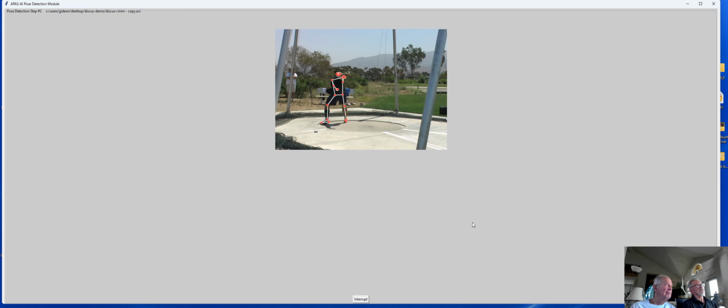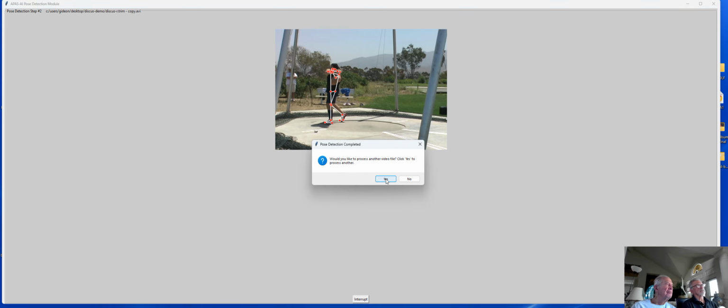And we'll just let it proceed until we have a box on the bottom that says, do you want to do another video? So all this process is done automatic, without markers. Indoor, outdoor, doesn't matter, so long as you have good light. And we'd have this choice now, do you want to do another video? And we'll say no.